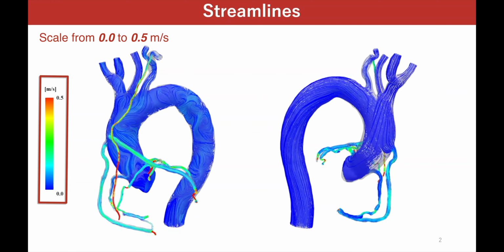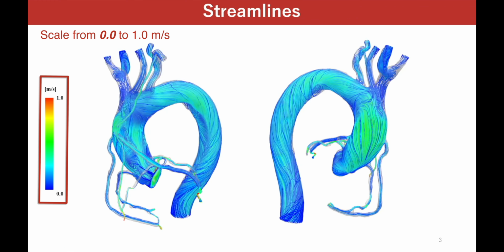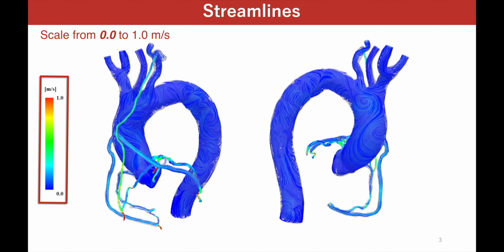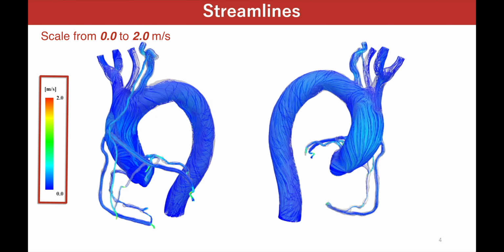These are streamlines scaling from 0 to 0.5 meters per second. These are streamlines scaling from 0 to 1 meters per second. These are streamlines scaling from 0 to 2 meters per second.